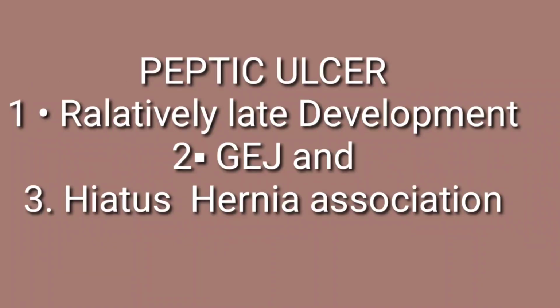Barium study is the best modality for the detection of esophageal strictures, whether of benign or malignant nature. As far as the benign esophageal strictures are concerned, they are divided into three categories. The inflammatory is the topmost. In the inflammatory category, the reasons for the development of esophageal strictures include peptic ulcerations.